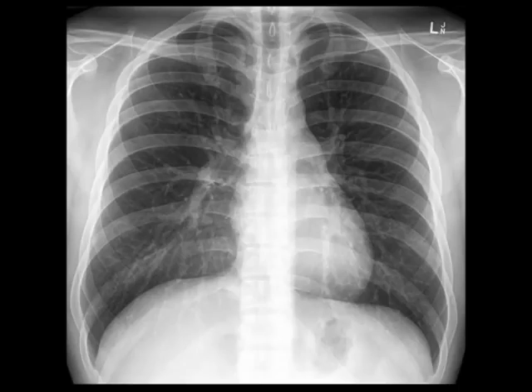Exposure is adequate, the patient is not rotated, and there is no motion blurring. Airway is central and patent. There are no fractures, lesions or defects visible in the bones. Cardiac silhouette is not enlarged. Both hemidiaphragms appear normal and with no blunting of the costophrenic angles. The edges of the heart and major vessels are clearly visible. Left and right lung fields are clear throughout. A gastric bubble is visible and there is normal hilar shadowing. In summary, this is a normal upright PA chest film.